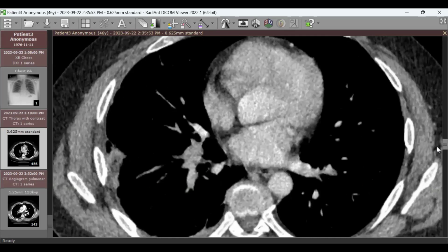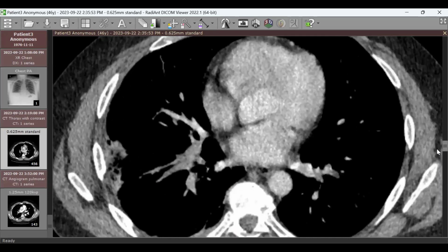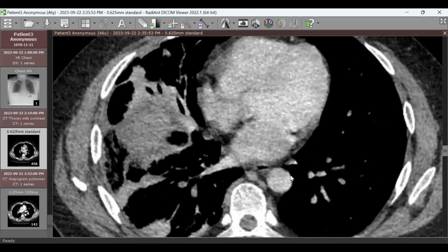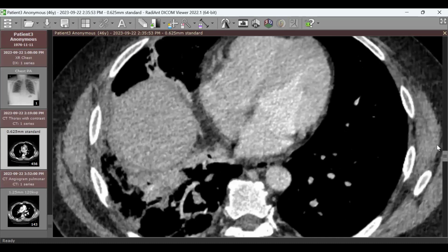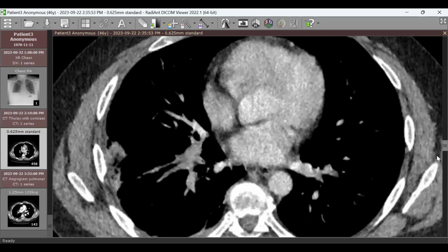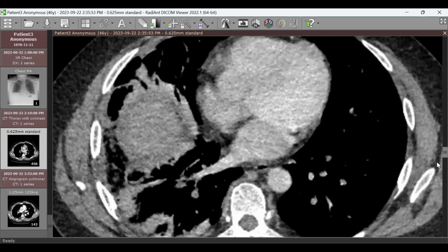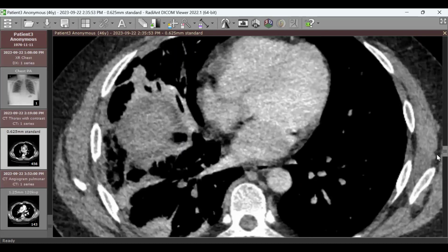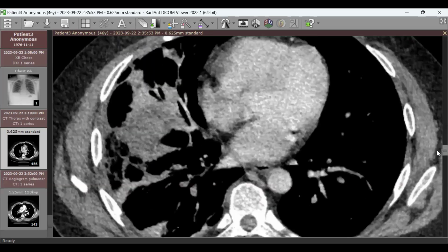And can we see a thrombus? Yeah, where? Follow the lower lobe artery. Here, right? Suspicion of a thrombus. Segmental and subsegmental mainly, involving medial basal, posterior basal, and also subsegmental, maybe involving the lateral basal. So what's the overall impression now? Pulmonary embolism with distal pulmonary infarction.